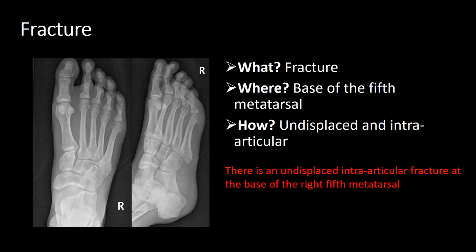So what is it? It's a fracture. Where? It's at the base of the fifth metatarsal. How? It's undisplaced and intra-articular.